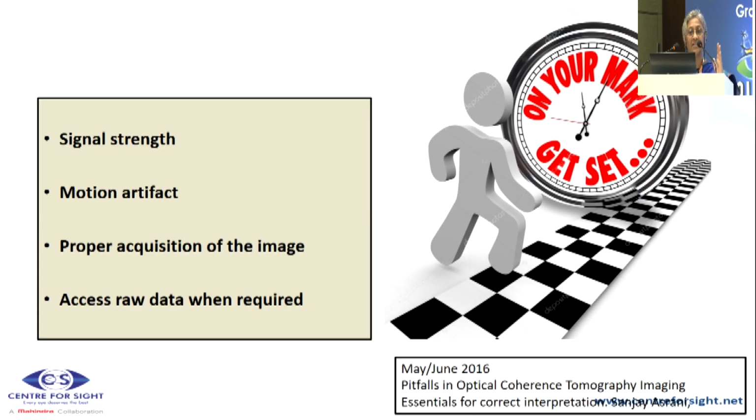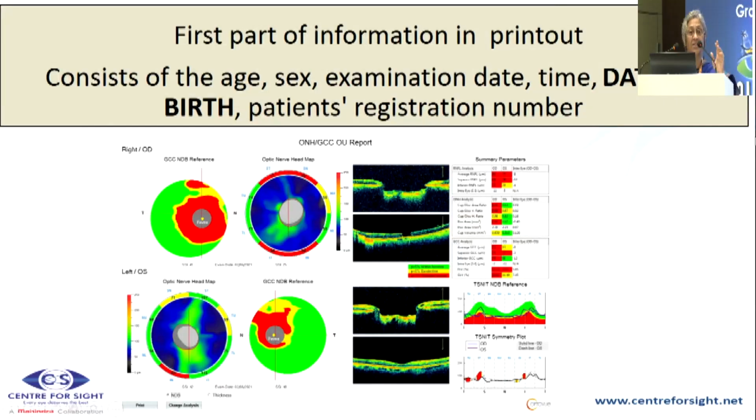So as we get set to go for the glaucoma diagnosis, look at the signal strength, motion artifact. Have we acquired a proper image, and also access raw data? Be like your retina colleagues. Please go and have a look at the OCT, whether it is correct or not.